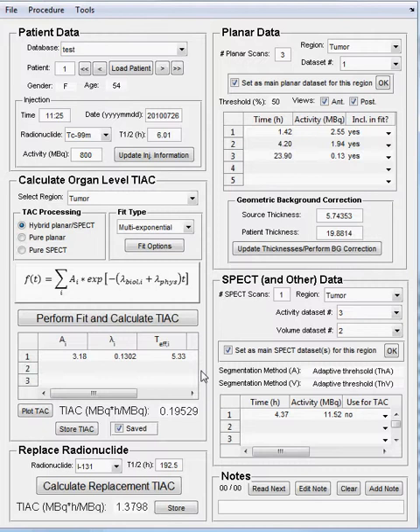What we're going to do is begin with another patient. So you'll also notice when you open JADA for the first time, actually there are two sample patients just in the sample patients folder. So this is sample patient 1. And now this series of videos will actually demonstrate all the steps you need to go through to gather this information, and we'll do that with the sample patient 2. So first thing we need to do is just begin a new patient. So we'll just add patient 2 to this test database.